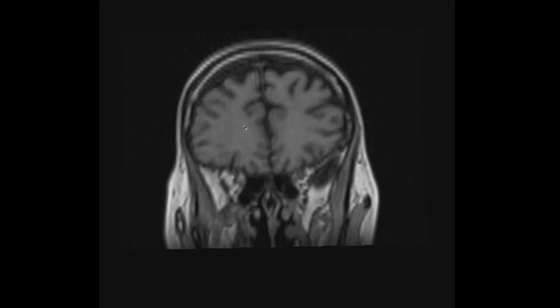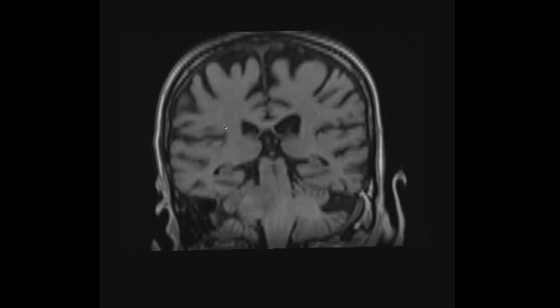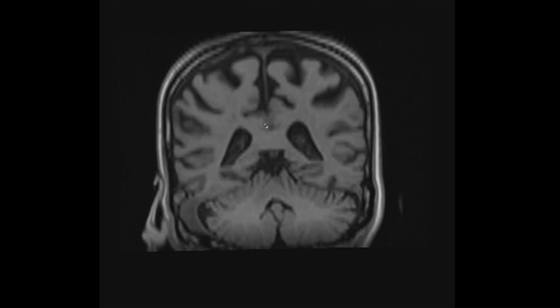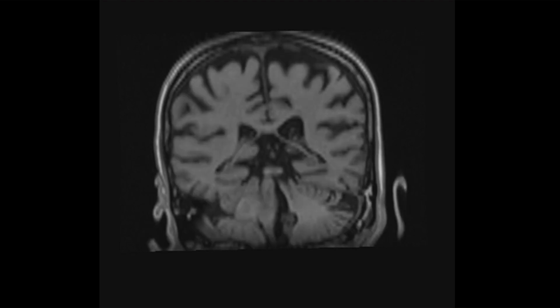Those types of things. So this is really a structural thing. I think probably the most useful for finding, or do they have asymmetric frontal lobe atrophy or encephalomalacia or atrophy of specific areas. And then to go along with these, this is not the order that I would look at this.